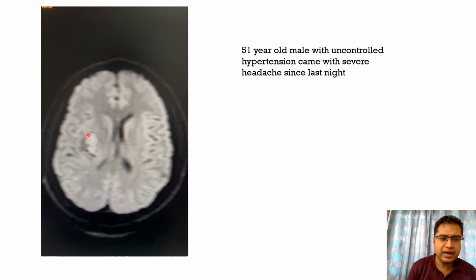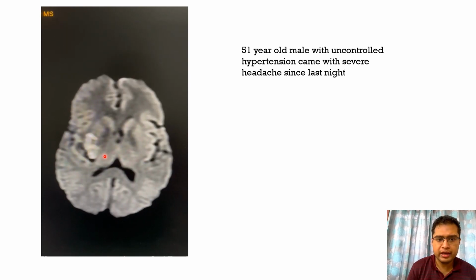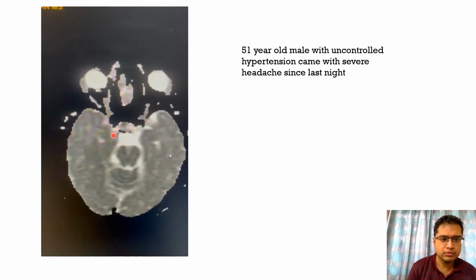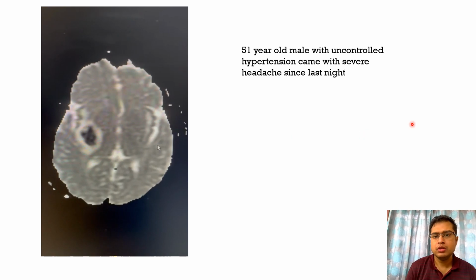On DWI there are areas of restriction, with a few areas of restriction on the corresponding ADC. So this bleed was in a hyperacute stage.